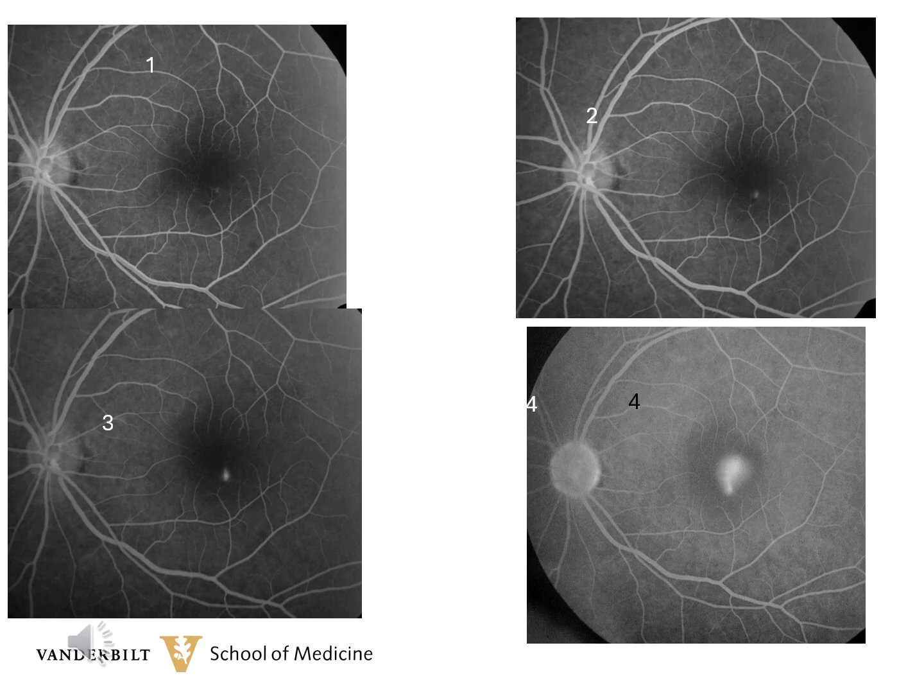And then finally, in the fourth photograph, this is a pretty classic smokestack sign where the dye is now leaking into the subneurosensory layer. Now you can see the fluorescein gets more and more as the angiogram progresses, and because the subneurosensory layer fluid is very diffuse, the dye borders are also very fuzzy.